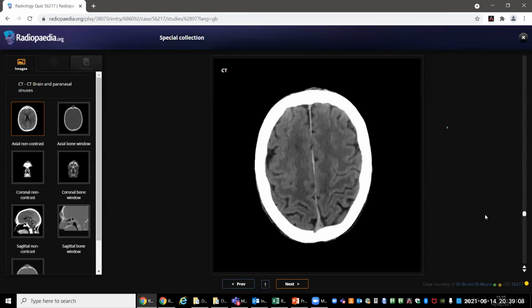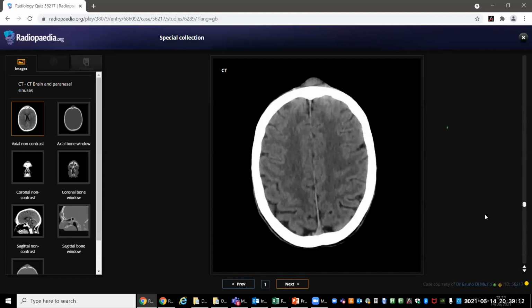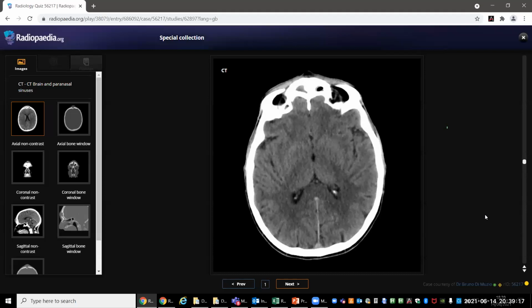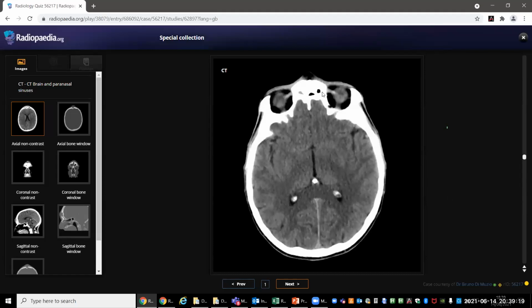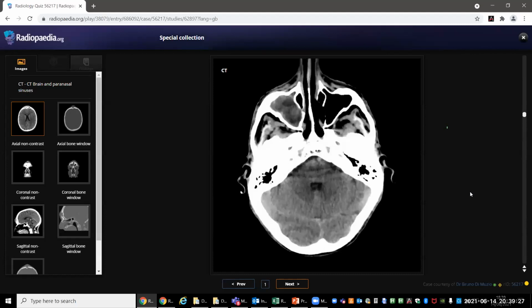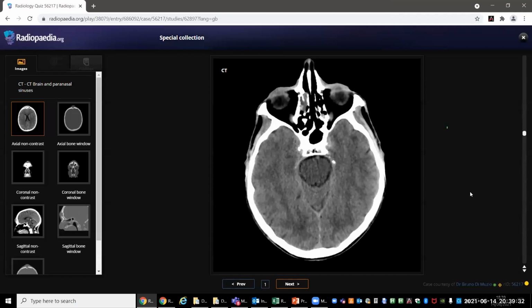I'm expecting the involvement of the adjacent cerebral hemispheres. For example, in this case, the frontal bones could be involved with intraparenchymal abscess. In case of ethmoid sinusitis, I would be fearful of subperiosteal abscess in the orbits. Any extension into the mastoids can even lead to complication of venous sinus thrombosis.